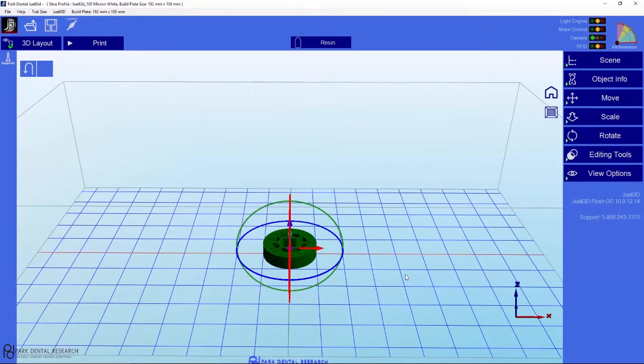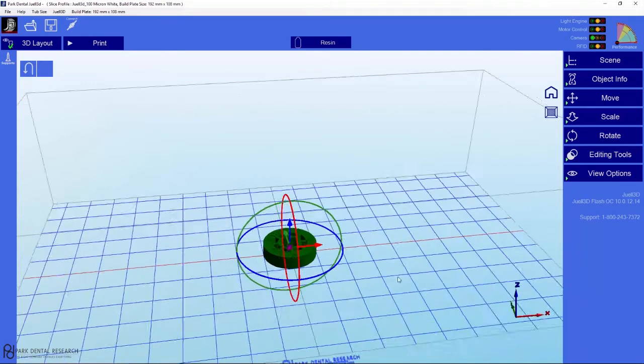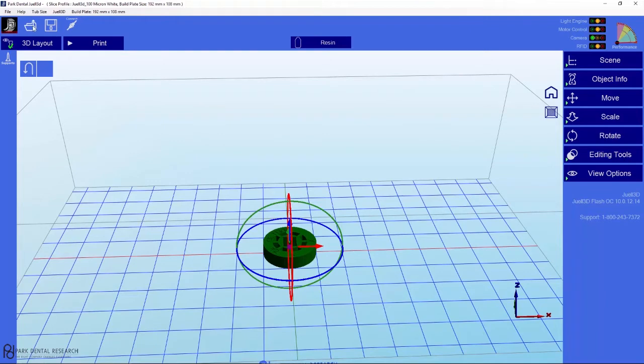That feature can be turned off, and it will speed up the loading of objects onto the build plate, but we recommend that you check each object through the automatic process of checking it for watertightness and for holes when you bring it on. So now the object is on the build plate, and that's basically what this does.